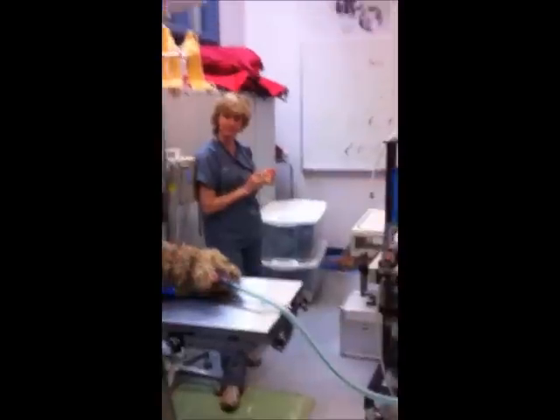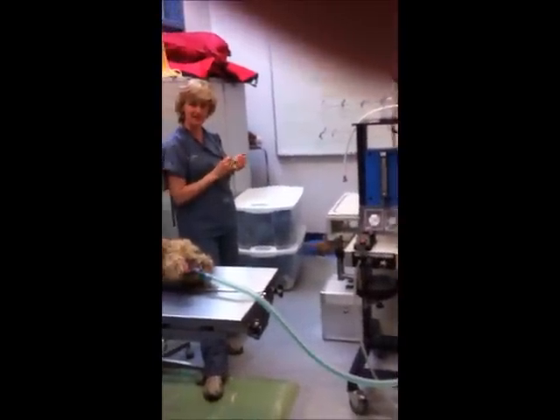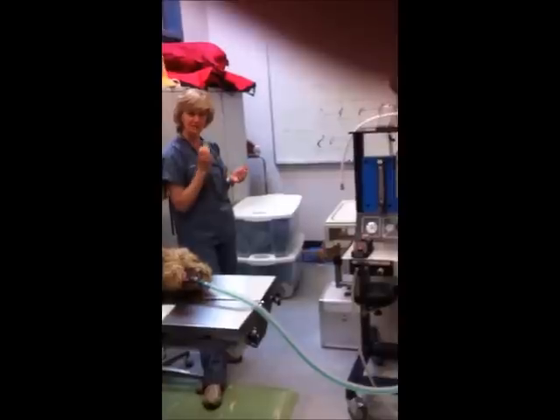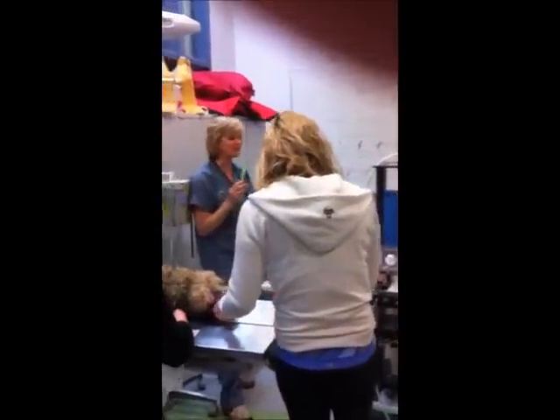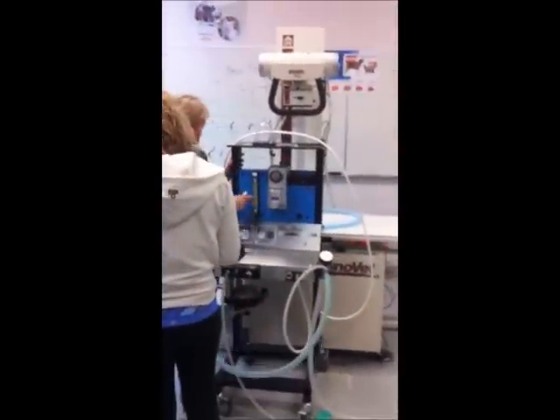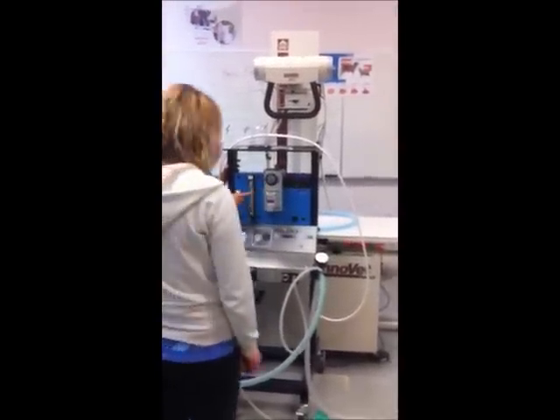So what was the thing that you were saying when you were standing at the back? What was the question again? Don't you need to know something about milliliters or... Right. Oh, the oxygen. So I'm not requesting that you set the flow meter and set the vaporizer, though, I mean, if you're running an anesthetic machine, that's absolutely important for you.